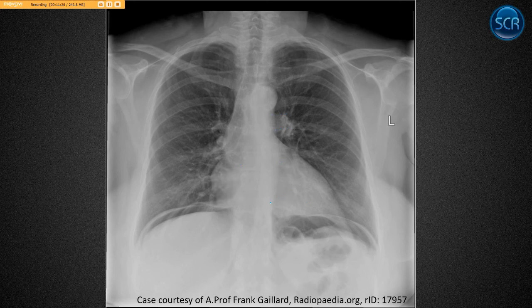And then we look at the abdomen, right? Now we get to the abdomen. Hemidiaphragm's nice and smooth. They're where you expect to find them, but right, we should have liver right up against our hemidiaphragm. There shouldn't be gas here. This person has free air in their peritoneum because they have some type of bowel perforation or something like that. So this is what pneumoperitoneum looks like, free air, kind of outlining the undersurface of the hemidiaphragm. Usually the liver would go right up there and you wouldn't see that.